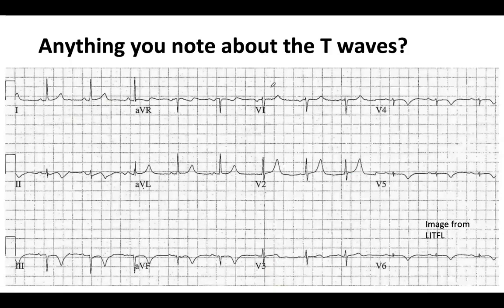Can anyone notice anything about these T waves? Just put it in the chat. Inverted, good, in lead 2 and 3. Anywhere else? Very good. Inverted in lead AVF, 3 and 2, good.